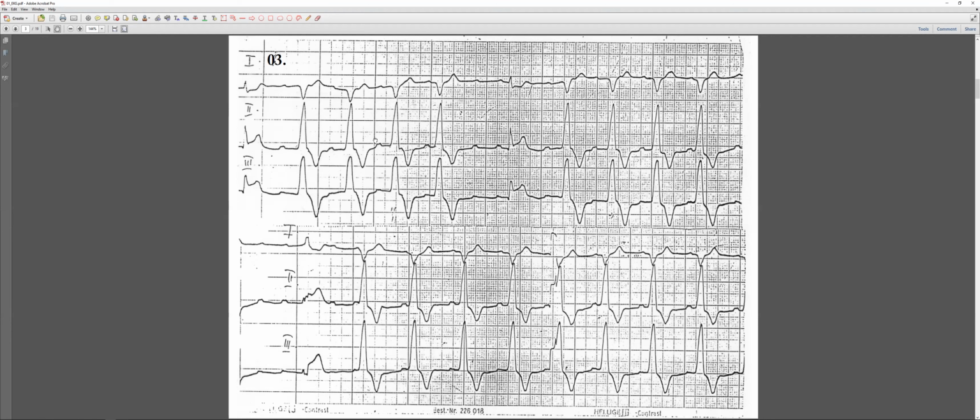So we do have a very rare connection between the atrium and the ventricle, and this is why we have a ventricular escape rhythm and the AV complete block as well. No, because you said that there is a connection between the atrium and the ventricle. Yeah, sorry. So which bit is conducted?